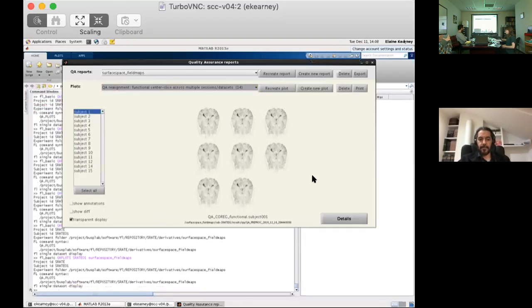So before, when you looked, you saw this somewhat uniform looking axial slice. Here, it looks different. I'm guessing that's because we're not rotating the scan into a particular orientation, and so you can have these oblique cuts through when we select the first one.